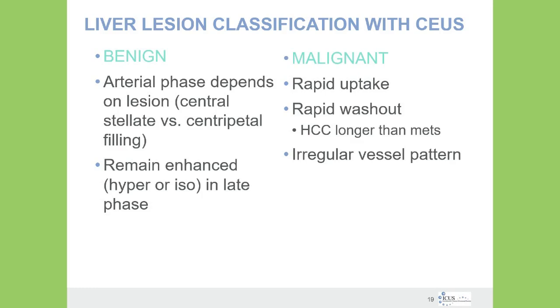That is one of the most important factors to remember in evaluation of liver lesions, that benign lesions remain enhanced in the late phase, and malignant lesions, because they take up that contrast and then dump it off, will wash out.